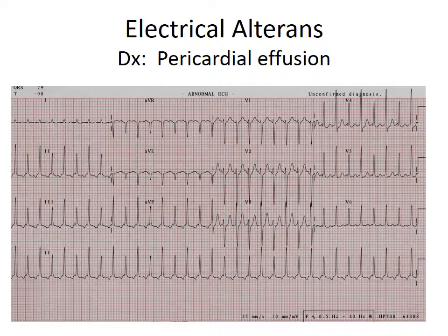It's alternating between. What happens is that's usually pericardial effusion, sometimes pericarditis. You get fluid buildup in the pericardium, and the heart becomes kind of squished from the fluid, but also because the heart is in that fluid kind of floating around, so to speak. When it beats, one time it might slosh toward the chest wall and give you a big electrical activity because it's getting closer to the EKG leads. And in the next beat, it's kind of pushed away.